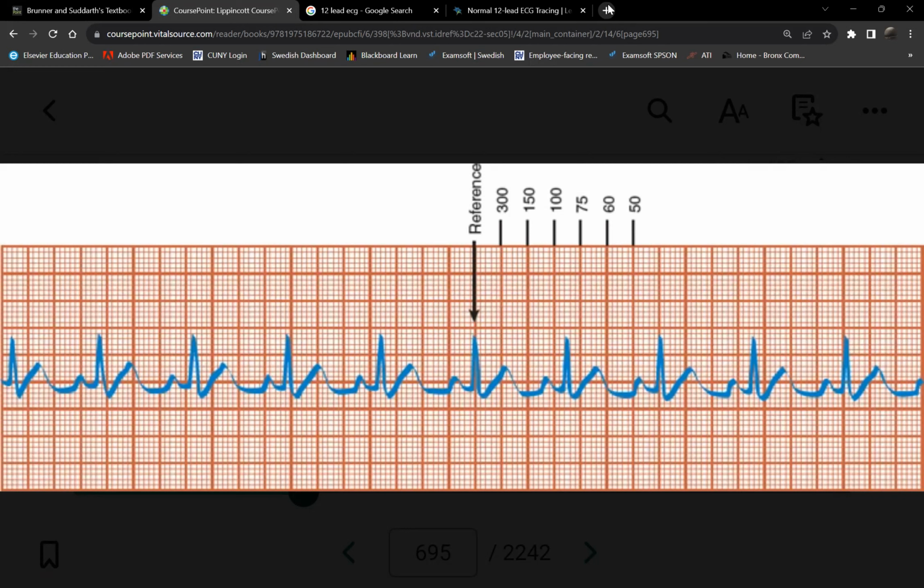Yes. What about the R wave? Those 2 R's, and then the next 2 R's, are they occurring regularly? Yes, they are. So what can you say about this strip's rhythm? It's regular. So can I use any of the 3 methods? Yes.